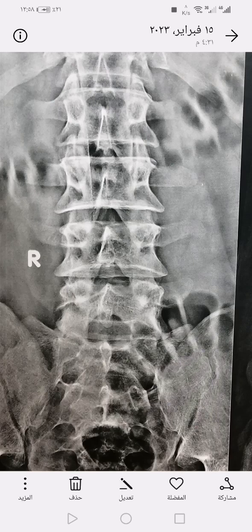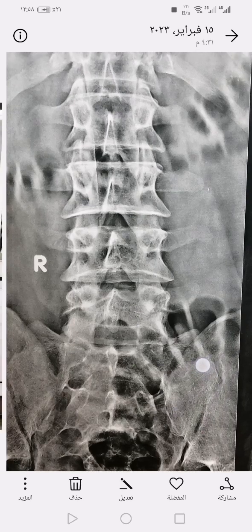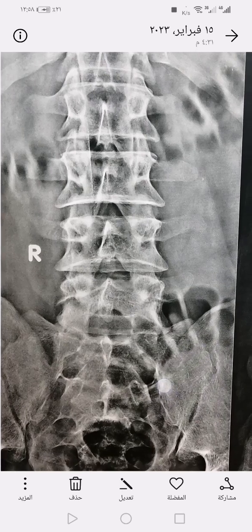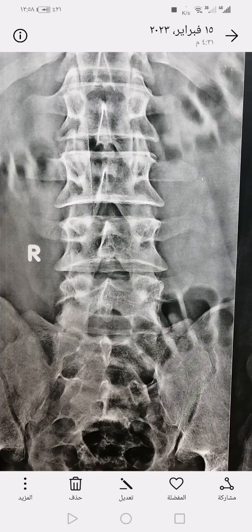The opposite is lumbarized S1, which means the lumbar vertebrae may be 6: one of the sacral vertebrae, S1, is separated from the sacrum and becomes similar to a lumbar vertebra.